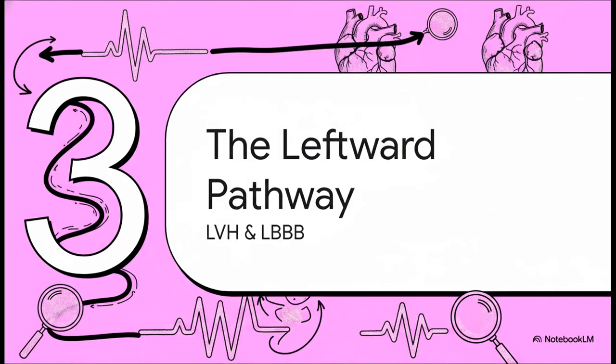All right, so let's follow that leftward path. When the axis points left, we now systematically hunt for evidence of left ventricular hypertrophy, or LVH, and the conduction issue that often goes with it, left bundle branch block, or LBBB.